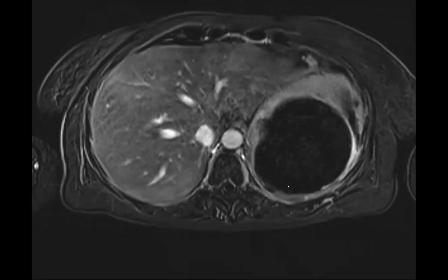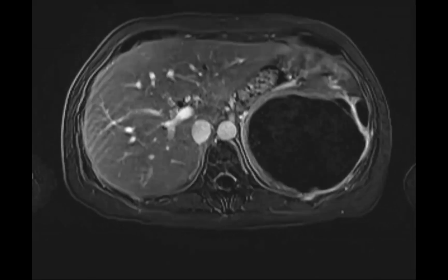Very unusual. I'm sorry, can you show the diffusion again? Yeah. And I will say another thing, on the final path, they resected the spleen, the distal pancreas, etc. And the final path said 19 centimeter squamous cell carcinoma. So then the pus, you're saying it just got super infected, or where did the pus come from? Yeah, that's what we think. It was necrotic tumor that got super infected. Oh, gotcha. Okay. So even satisfaction of search can happen after you aspirate.